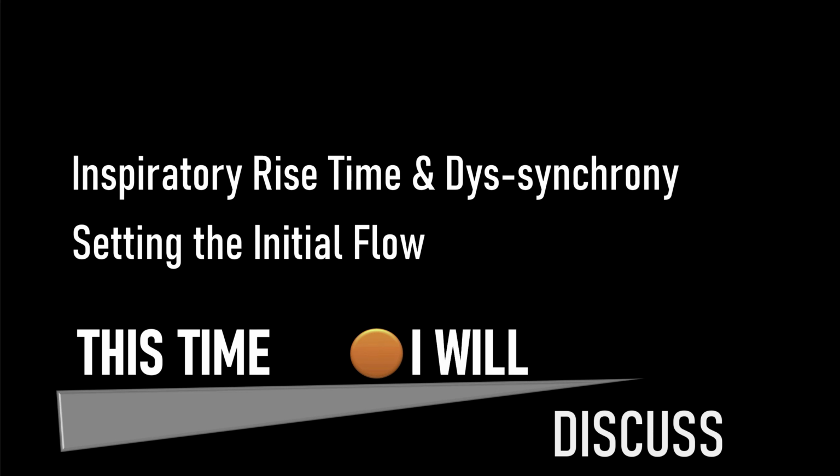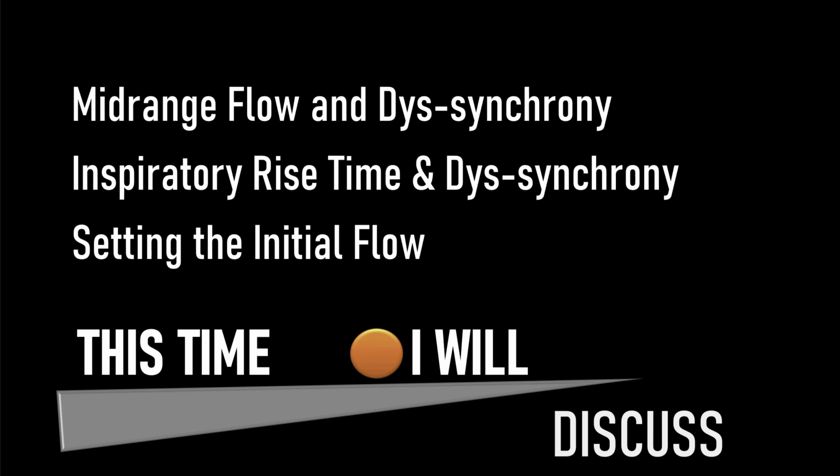Subsequently, we're going to see what happens after the initial flow of gas has completed and the patient is still inspiring and gas is still flowing and we haven't reached expiration. And I call this midrange flow. And I'm going to talk a little bit about dyssynchrony during midrange flow in this tutorial.